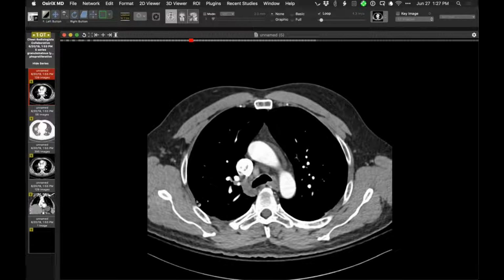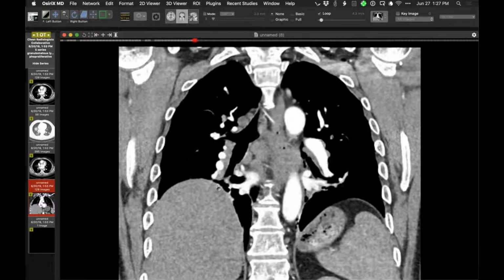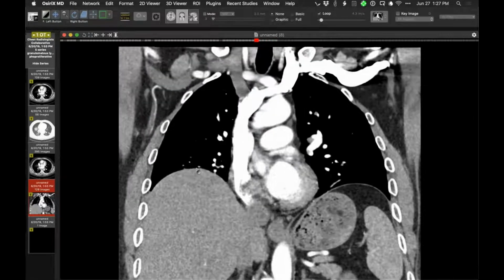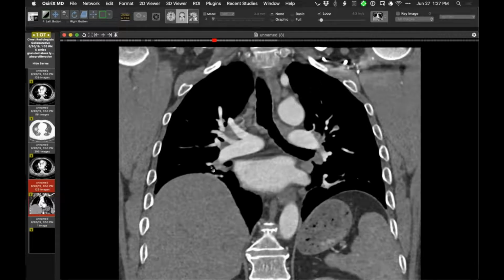But this I want to show you is a really nice example. Let me bring up the coronal of the involvement of intrapulmonary lymphoid tissue in relation to relatively small vessels and bronchovascular bundles. And some of them, if you scroll through fast, I'll show you a couple, may initially look like pulmonary emboli. So let me just go and find a couple that I saw.